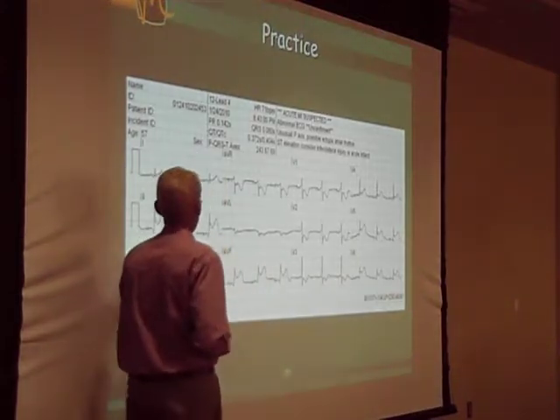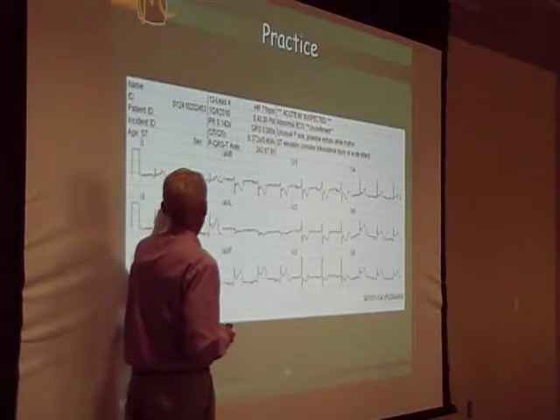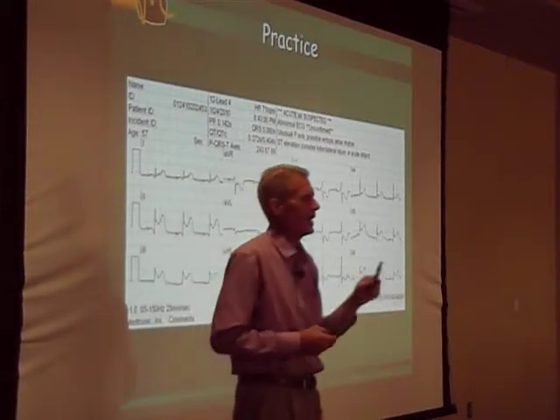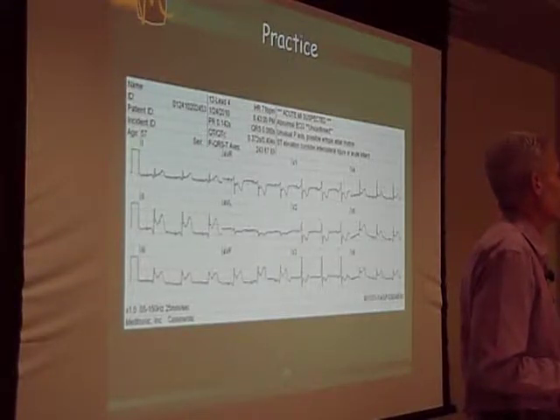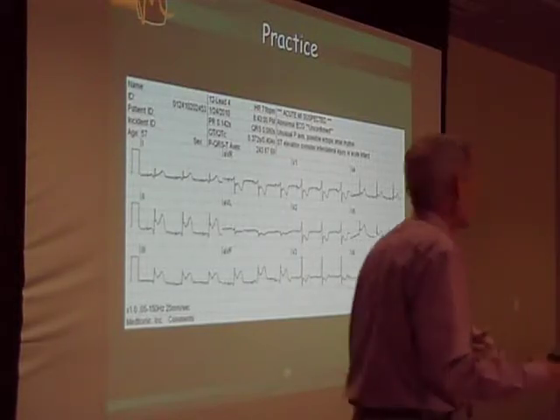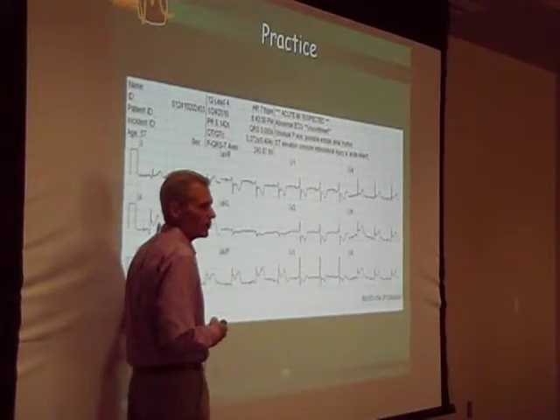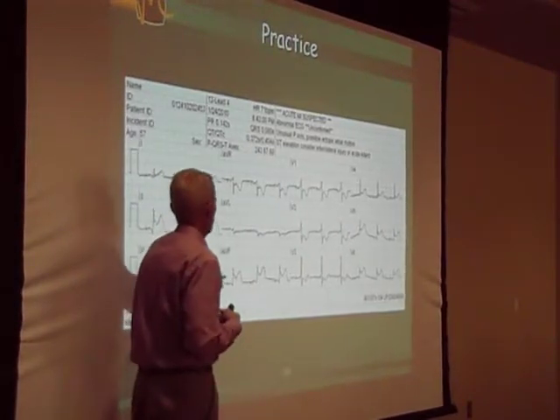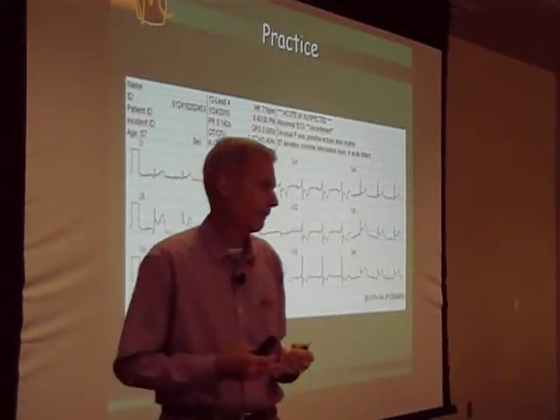This pacemaker is attached to the atria, not the ventricle. So we have a pacer spike before the P wave. So it raises the question, does that affect my interpretation at all? It doesn't. If it was a paced ventricle, then I would have concern because that causes distortion. But the movement of electricity through the ventricular region is not affected because the pacer wire is attached to the top of the heart. So while I make note of that, this inferior wall presentation plus the reciprocal change along with it stands to reason. Makes sense.